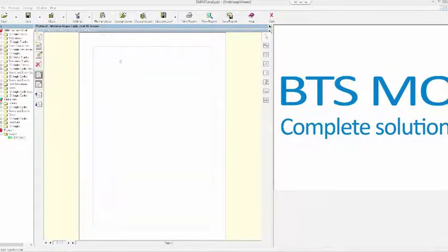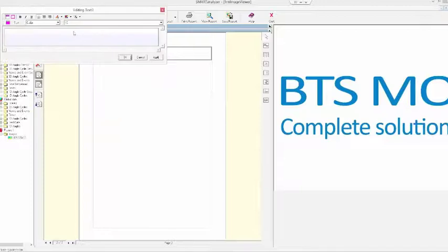Imagine that, for example, this second page will contain, for example, the 1D kinematic result. So let me start by creating a title. Okay, from here we can again edit the title, for example, 1D kinematics analysis.